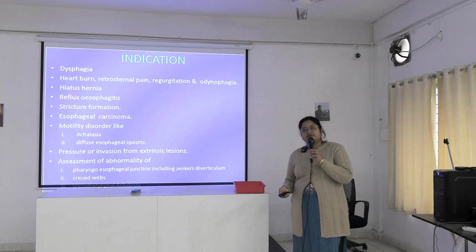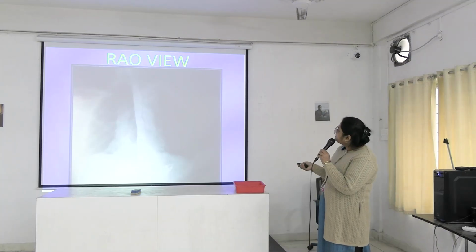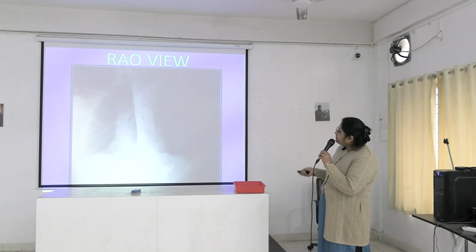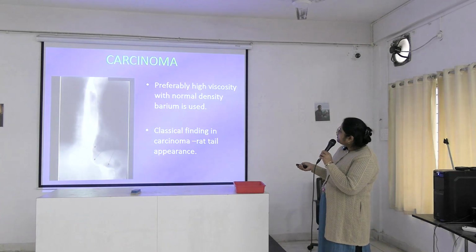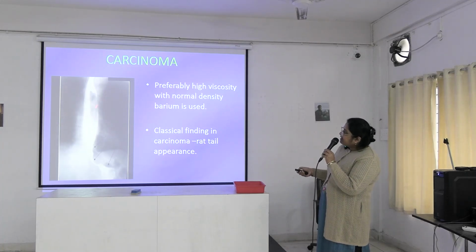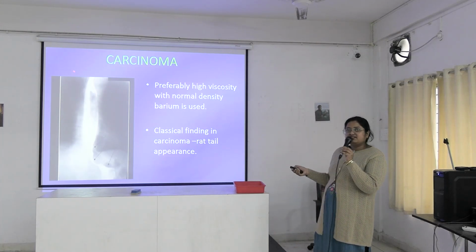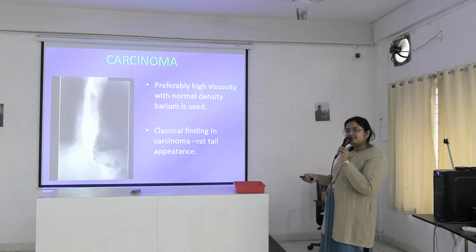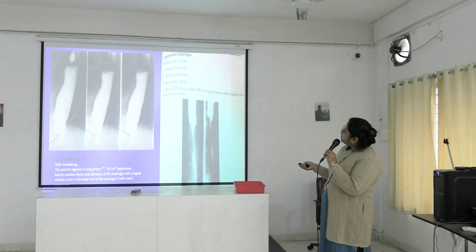Just look at these X-rays. This is the right anterior oblique view. In esophageal carcinoma, there is abnormal dilatation and here is one mass formation. Mass formation will lead to a filling defect. Okay, like this. This is carcinoma esophagus. Here is the mass.